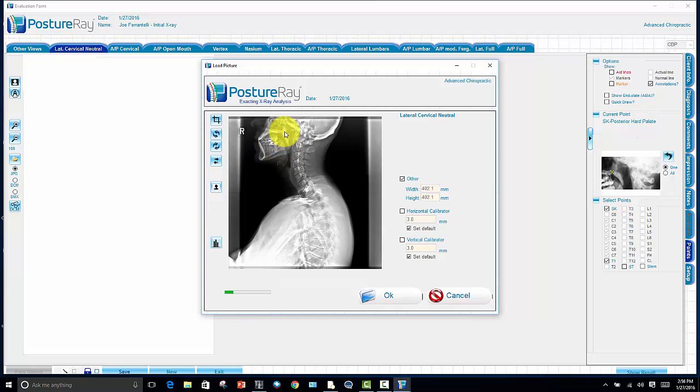So we always want the lateral views to face to our left by convention because we have to do them in a predefined order when we digitize. So I'm sorry if the doctor views the x-rays to the right side. It's irrelevant if they do because we can always flip the x-rays to the other side, okay? But digitizing is always going to be to the left. No matter what their preference is, it's always going to digitize to the left because the output, we can flip them the other way for the view box and exporting images, okay?